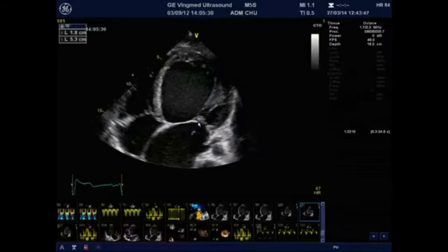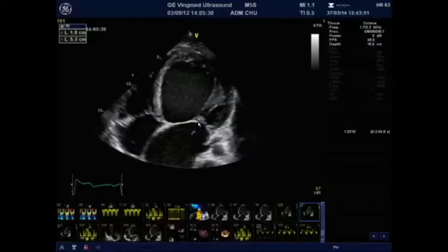When it is greater than 1 centimeter, for sure this is again a sign that there is a severe restriction and displacement of the mitral leaflets toward the apex of the left ventricle, and often it is associated with recurrent mitral regurg after mitral valve repair.